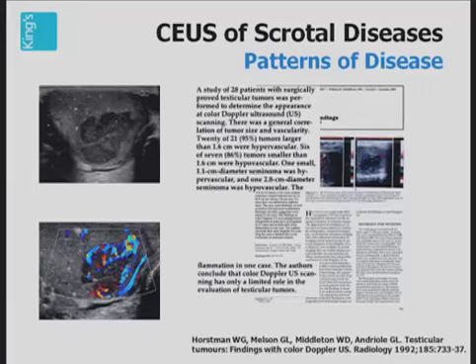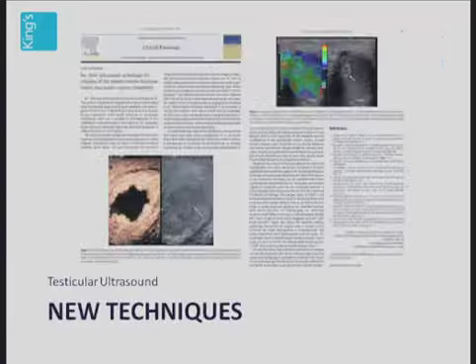If we can add contrast-enhanced ultrasound to this pathway, bearing in mind that contrast-enhanced ultrasound exquisitely demonstrates the vascularity of the lesion, we should perhaps be able to ascertain whether or not a lesion is malignant or benign, entirely based on the vascularity.